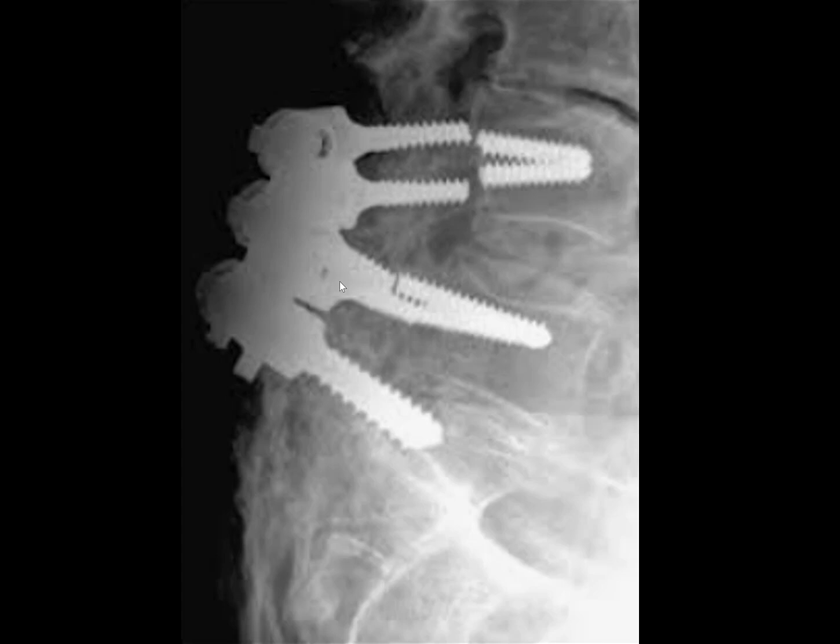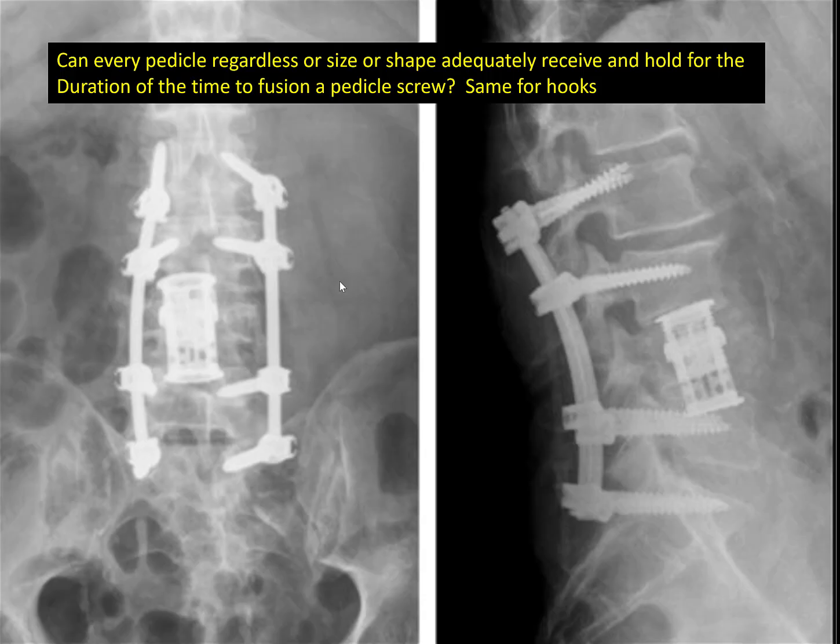Osteoporotic, I've seen very few cases like this. This is like the old school screws. The old screws used to break a lot. I don't see new screws breaking that much. But you see them loosen in the bone. I see them loosen in the bone, but I do see some of this.